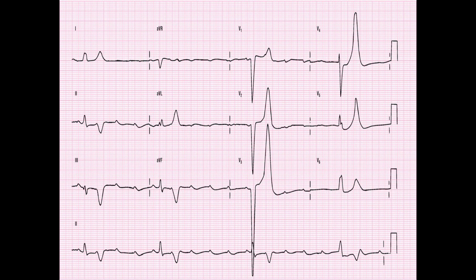Okay, what about this third EKG? Oh my god. What's going on here? There's so much going on. So first, rhythm. What is the rhythm? We're going to give you a second. I'm going to take a sip of water. Well, you look at this. Okay. So what's the rhythm? Slow. If you said slow, well, slow is not a rhythm. Congratulations.